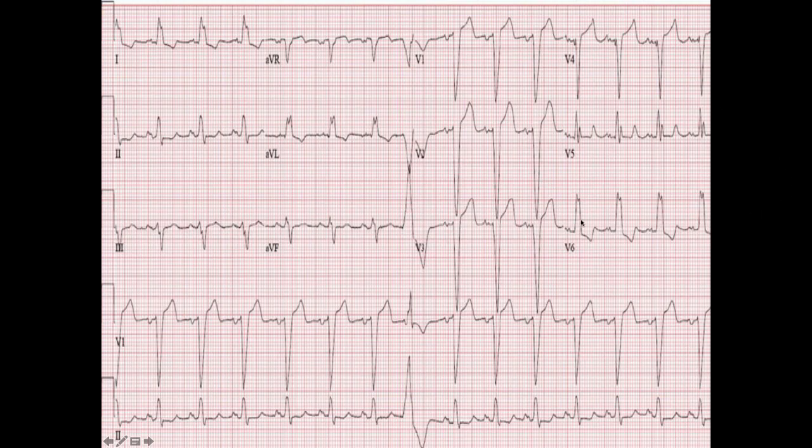Do we have any ventricular hypertrophies? Well, maybe we do, but we can't diagnose that off the 12 lead. Because remember, with a left bundle branch block, we cannot call any LVH, any left ventricular hypertrophy. We can't call any RVH, any right ventricular hypertrophy, because this is just causing this screwy aberrant conduction pattern to begin with, so we can't really confirm LVH or RVH.